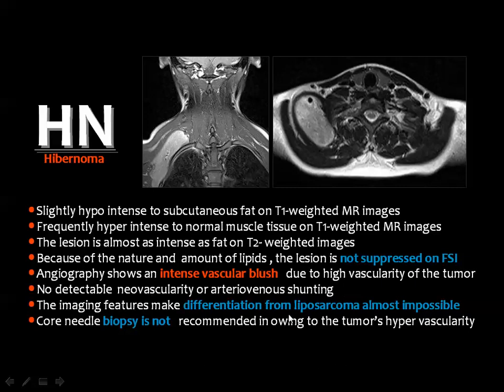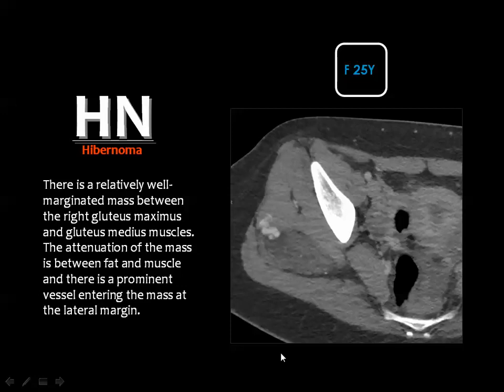And the differentiation from liposarcoma may be impossible. Many times, if you are going to have a biopsy from this lesion, be careful, because this lesion is hypervascular. And this is a hibernoma.